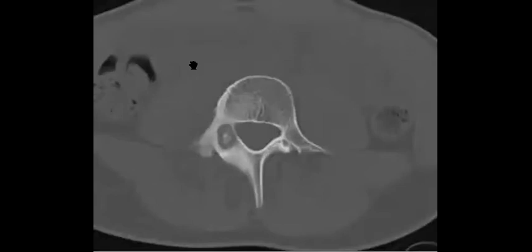When you go to the sagittal images, and in the coronal images again, it has the central nidus in the right L4 neural arch surrounded by some sclerosis.